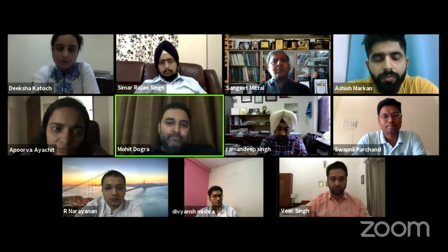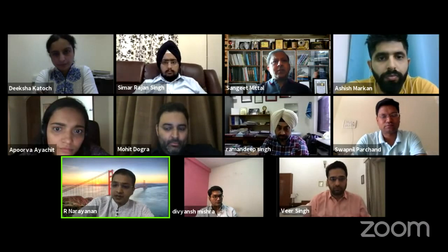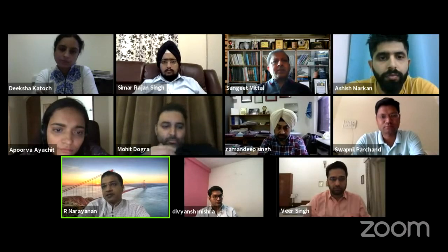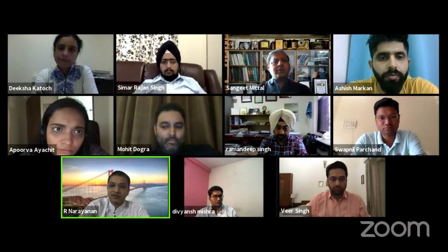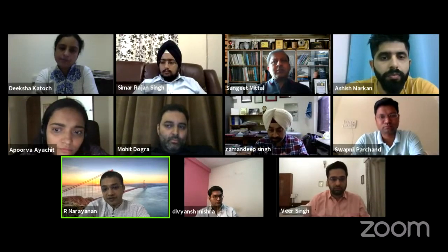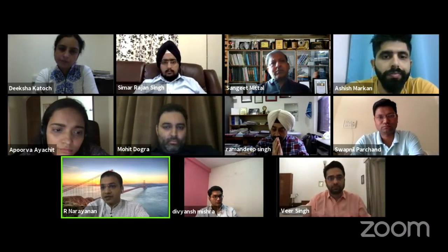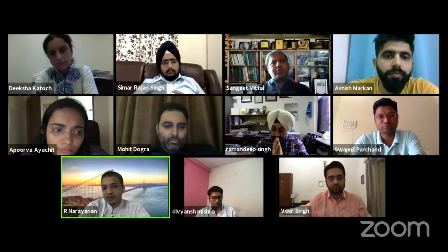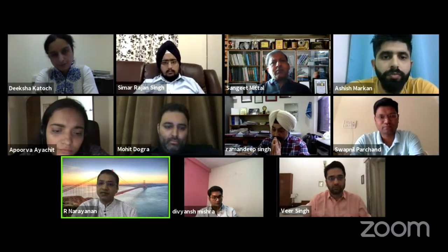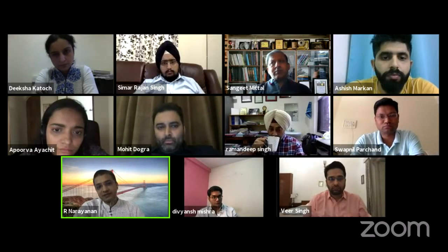Yeah, very nice presentation, Swapnil, and you have brought out a very important point: whenever you have a bilateral presentation of multiple hemorrhages, sometimes they look like CRVO also, in the sense of lots of hemorrhages. But if you look very carefully, why should a patient develop a bilateral picture like that? Sometimes there is some venous tortuosity, and those very fine yellowish white lesions you mentioned, the granularity, should immediately raise suspicion of a blood dyscrasia. Any blood dyscrasia can cause it. In fact, the more common ones are CML and sometimes AML.